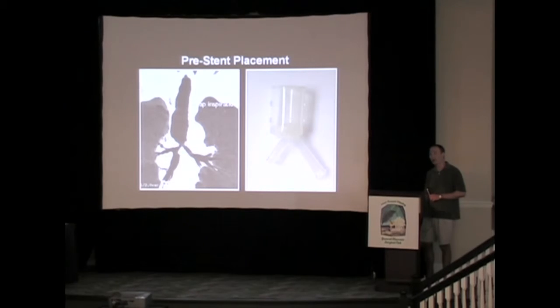For patients requiring airway stents, one size does not fit all. This was a person who'd had prior surgery and radiation with a large trachea, very small carina, and small main bronchi, and the coronal CT could be used to make a custom stenting device that would be ideal for this particular individual.